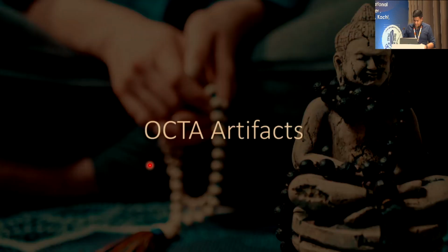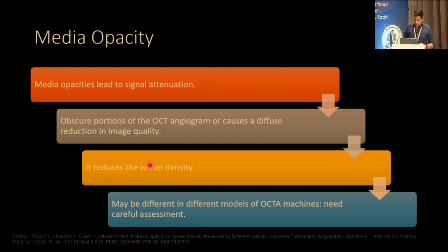What are the artifacts? These were the machines and the basics about OCT. I'll just talk about a very few points about OCT artifacts. There can be media opacities. Media opacity leads to a lot of signal attenuation, obscures a portion of the OCT angiogram, or causes a diffuse reduction of image quality. It reduces the vessel density.